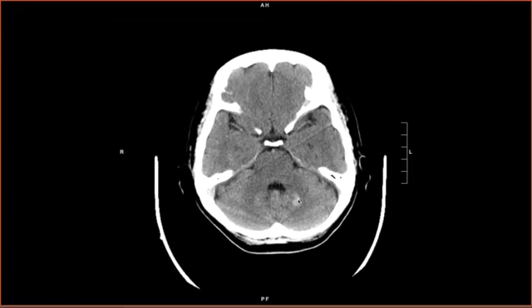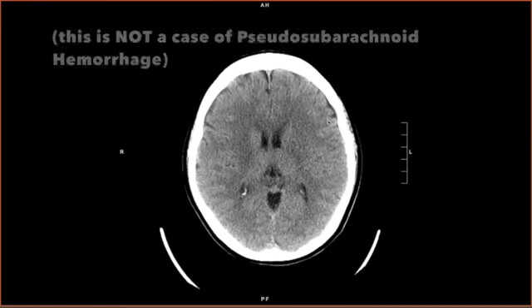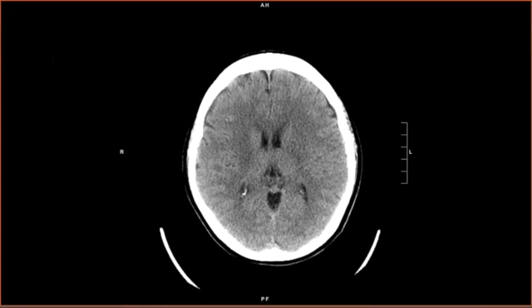its appearance and unilaterality. You might have also heard the term pseudo-subarachnoid hemorrhage, which occurs when the entire brain is edematous and dark, and the vessels in the sulci appear bright and can be mistaken for blood. Again, you don't need to worry about the details for now. Just understand the principle. Not everything that looks bright in the brain is going to be blood. These are some common fake-outs.